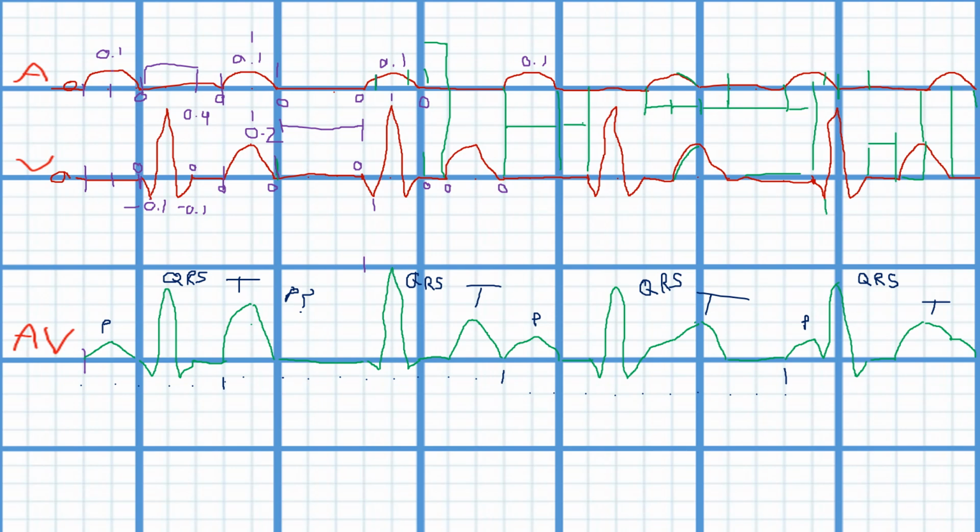So, is that because we have a P wave here, right? And so once again, kind of P question mark right there. All right. So keep going along right here. So what we've got is our 5. Let's count 5 more in the other direction here. All right. 1, 2, 3, 4, 5.